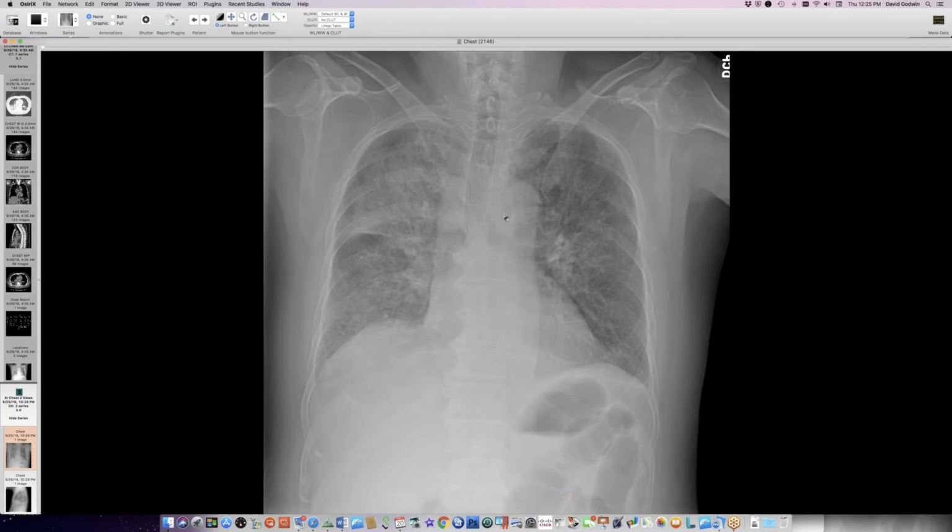So most pneumonias more commonly will present with localization to one lobe or something like that. So a multilobar pneumonia at presentation is a good finding for Legionella. It's often a ground glassy pneumonia that makes you think of viral infection or pneumocystis. It can be dense as well. It can form lung abscesses, so it can be cavitary.